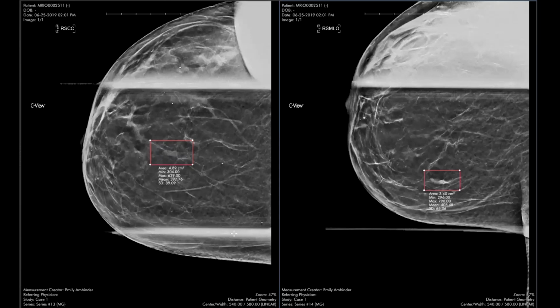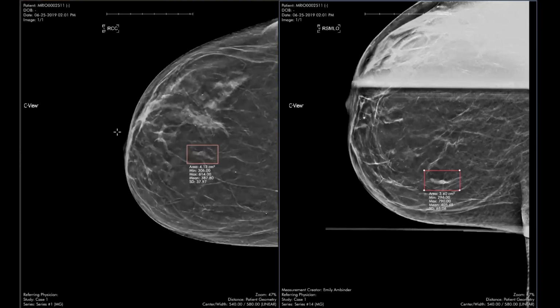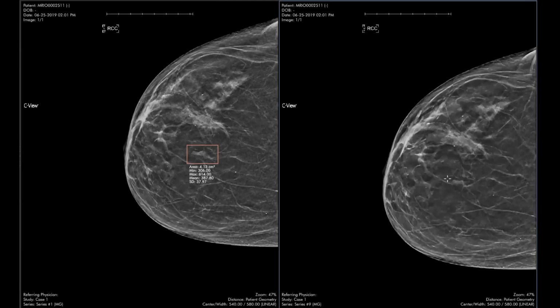This is a good indication for a BI-RADS 3 on mammogram. This is a focal asymmetry on a baseline mammogram without a sonographic correlate. This patient was recommended to come back in 6 months. So we had follow-ups at 6 months, at 12 months, and 24 months, as I talked about before. Again, this was the baseline screen. And this was her 2-year follow-up exam.